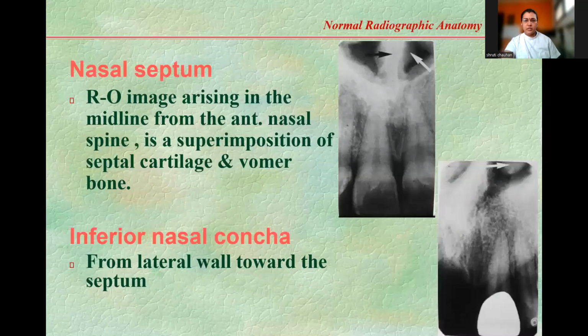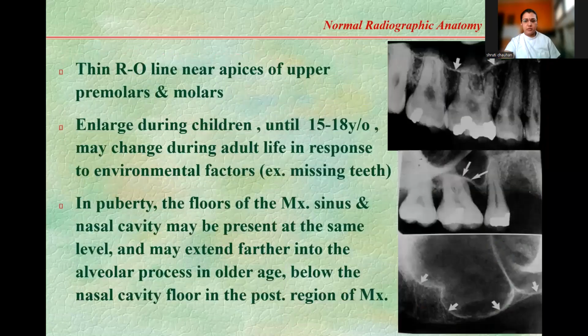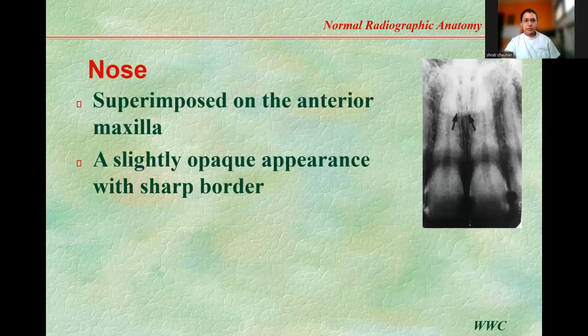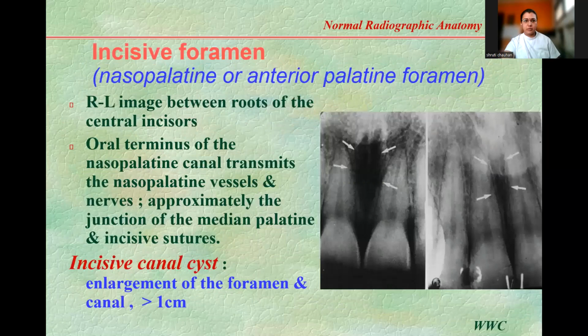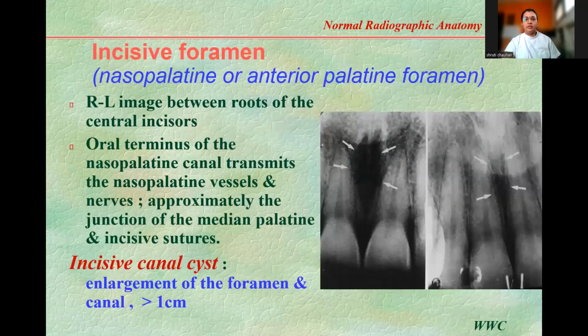We have covered till the nose, right? We have covered till the inferior nasal concha, which we have completed. So today we will be progressing forward. We're still on the maxilla, so the next is the incisive foramen.